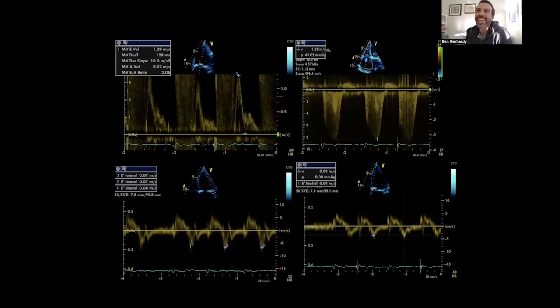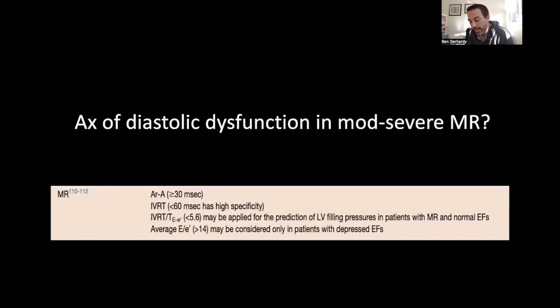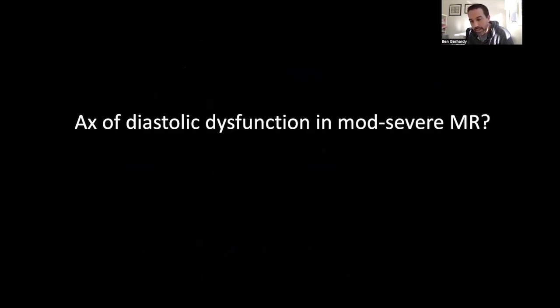Yes, I did. If you've got significant mitral regurgitation, it will throw out, I'm going to work backwards, your left atrial volume. You can't fake someone's pulmonary venous waveform. So if they had global blunting, like all 4 pulmonary veins, I'm going to say it's more indicative of raised left atrial pressures.